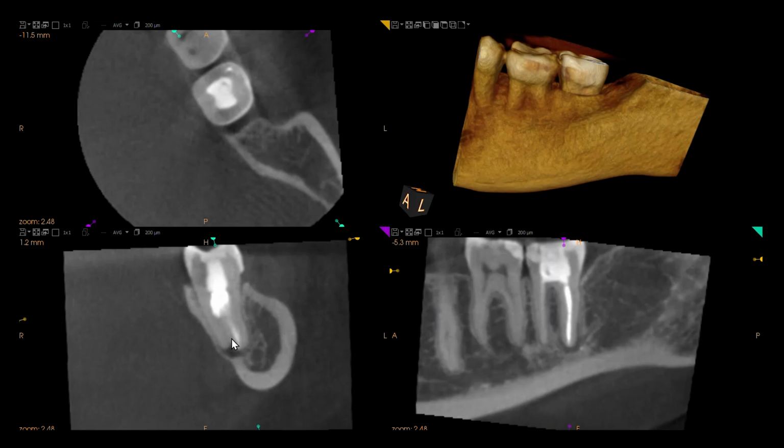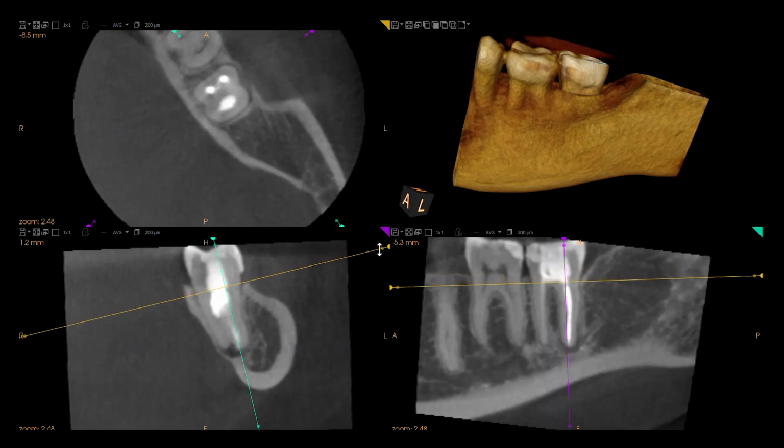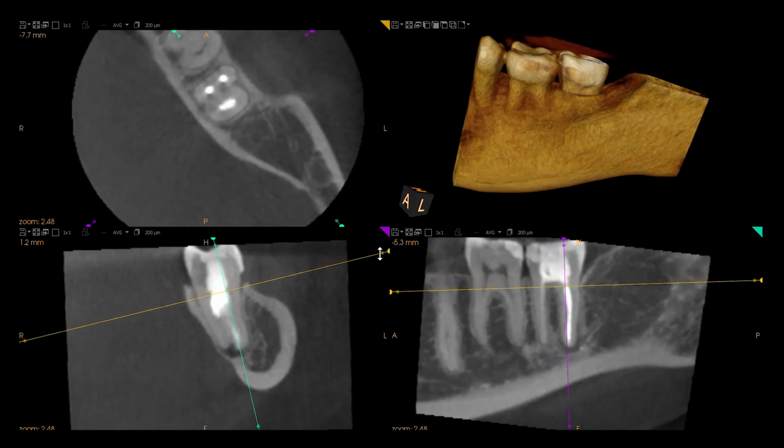So what we also see is a lingual, a second root. If we examine the slices as we come down, and we examine this panel right here, the axial version, what you'll see is the distal canal at this point in the tooth looks pretty centered in the center of the root. There's our mesial canals. So this looks pretty good.